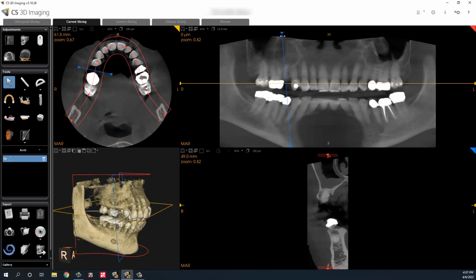You can see that she fractured off the lingual aspect, and she does have a buccal plate, or a palatal plate here. It's just really thin looking. So that might affect our ability to place the implant. Might not. We'll see. But again, for now, we're just going to pretend it's an ideal situation. So let's click on this button right here, and it's to add an implant. And I could skip this if I wanted.